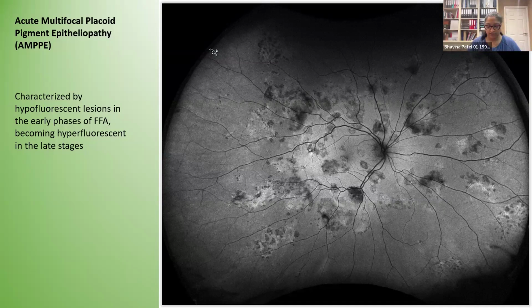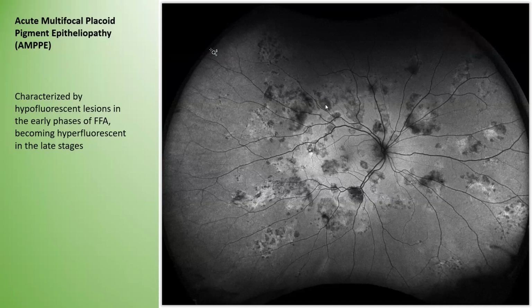Yeah. So this is obviously the autofluorescent appearance here then. And you can see here with autofluorescence the hypofluorescent areas consistent with the inflammation that's taken place on the retina. And you can see why patients will complain of seemingly loss of visual field. And you can see the hyperfluorescent area in the centre here where the inflammation has caused interruption to the metabolic activity within the retina. So this is where you may get the patient complaining of blurring.